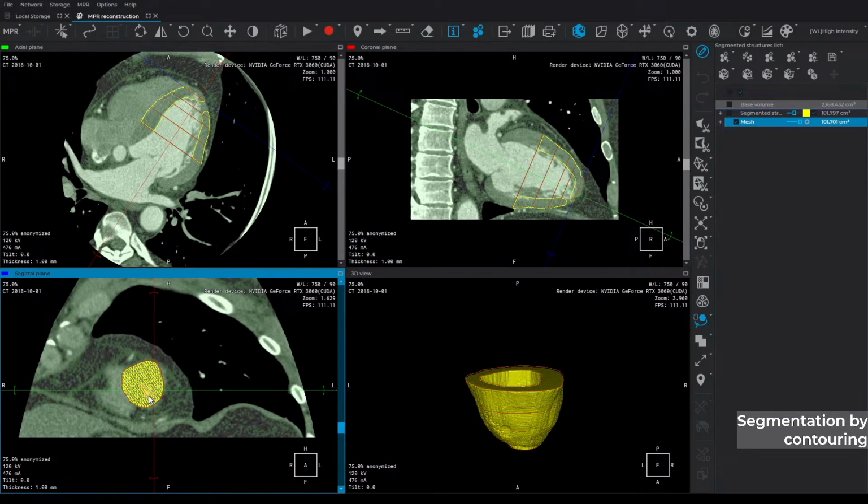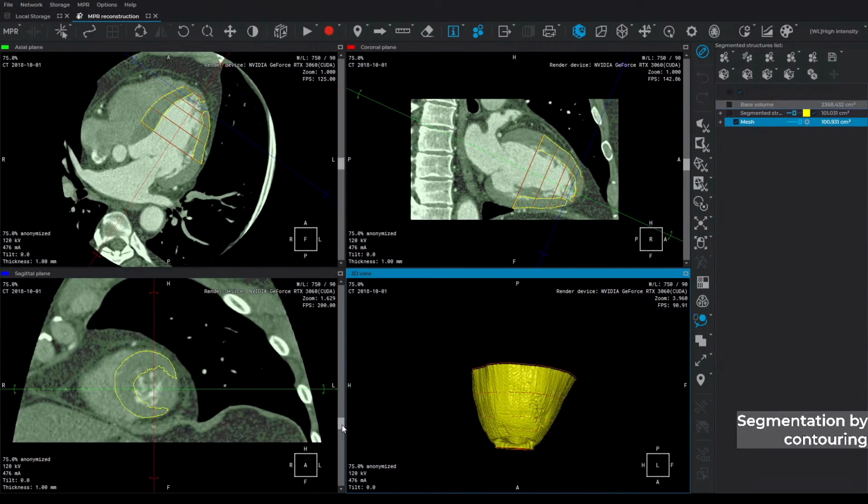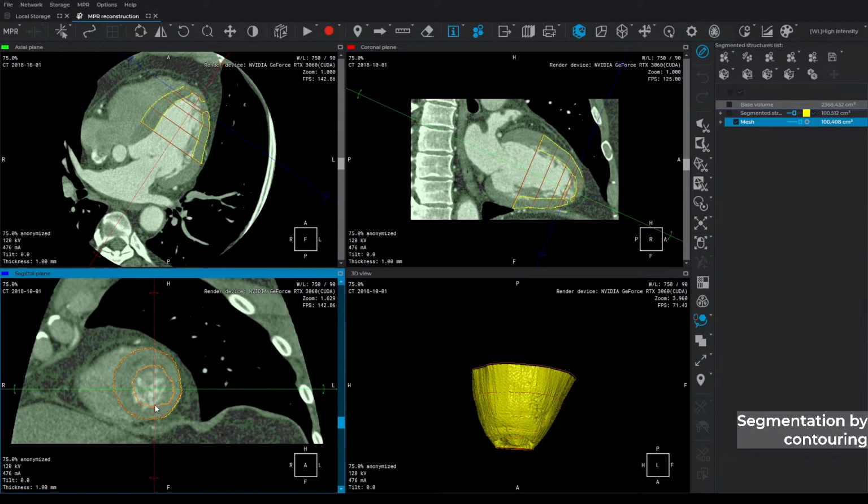That makes it harder to segment by threshold, as we were doing earlier with the skull. So these kinds of tools are perfect when you can visually see the difference between one structure and the other, but threshold doesn't work very well. So contouring is perfect. Thanks a lot.